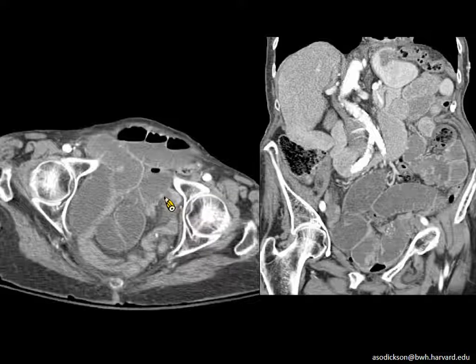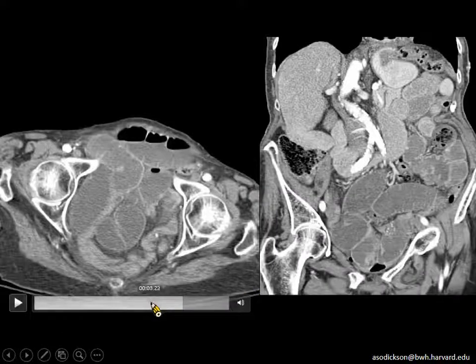but unless something is done for this, unlike an adhesive small bowel obstruction or an edematous small bowel obstruction, this will not improve. So the surgeon will often try to manually reduce hernias that are causing small bowel obstruction, but if they can't do that, even though this is a fairly conventional bowel obstruction, this patient will go to the OR in order to reduce this and salvage bowel.